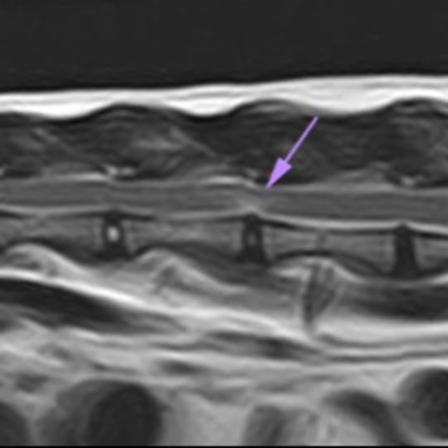Moreover, the number of the affected intervertebral discs could be indicative of the type of intervertebral disc herniation, so we saw that the involvement of a single intervertebral disc is more frequently associated with the acute non-compressive nucleus pulposus extrusion compared with multiple intervertebral discs affected by intervertebral disc protrusion.